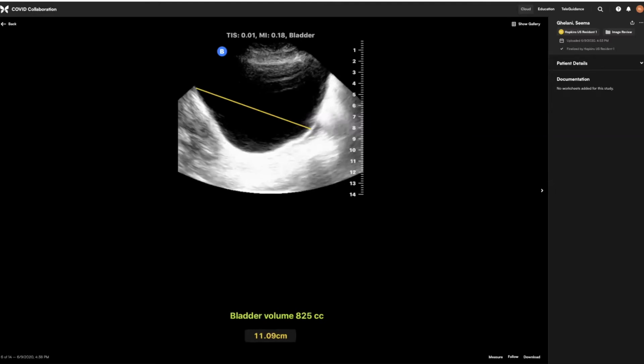Yeah, that's a great question, because I was going to comment on this too. So if I was giving feedback on this image specifically, besides the gain issue, I would say, hey, listen, I'm not entirely sure this is truly the height. I probably would have swung this out more into getting more of the maximal diameter, if you will, on this image. Now, they might not be wrong, because we know we have a 3D structure. It's not specifically a pyramid shape, but I probably would have taken this measurement out to there. I don't know, Mike, do you agree?